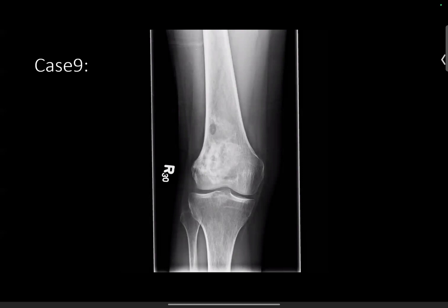Sometimes you can get a little abnormal signal in the cortex. You'll have unexplained marrow edema in multiple bones, and then a history of surgery on that side or whatnot. That's a very challenging diagnosis, and it's often a clinical diagnosis as well.